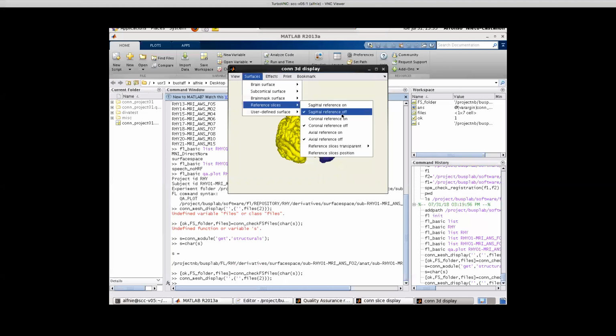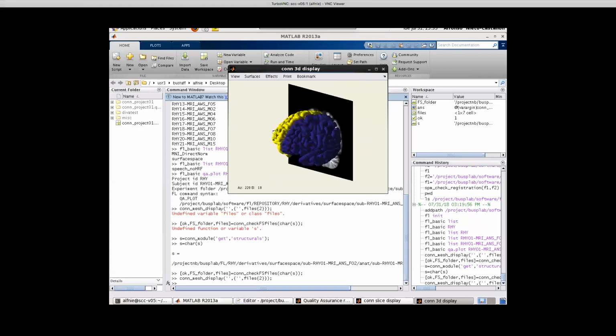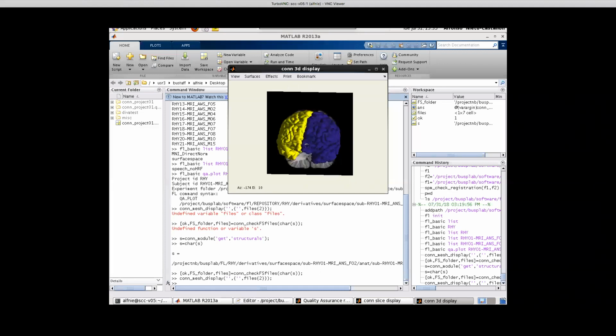Your surfaces, not the FreeSurfer surfaces? No, these are the FreeSurfer surfaces, actually. These are the FreeSurfer stuff, but I don't have here the actual functional or structural data. I have like a reference. So imagine that I could generate something that shows you basically this. This is what I mentioned as the three-dimensional subject-specific surfaces. Is this useful? Is this useful at all?